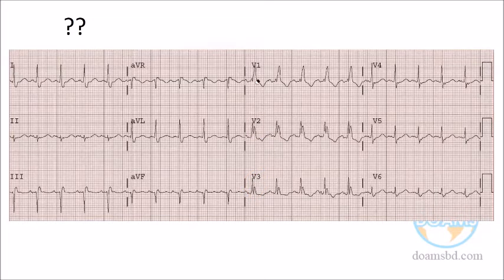So, this is a wide QRS. In the opposite lead, that means the lateral 5, 6, it is becoming wider. It appears to be W, but not a clean-cut W. But what else is visible here in the 5, 6 leads, Dr. Karishma? Sir, this deep S is also there. Rather, we said the slurring of the S. Slurring of the S is very characteristic for which block? Right bundle branch block.